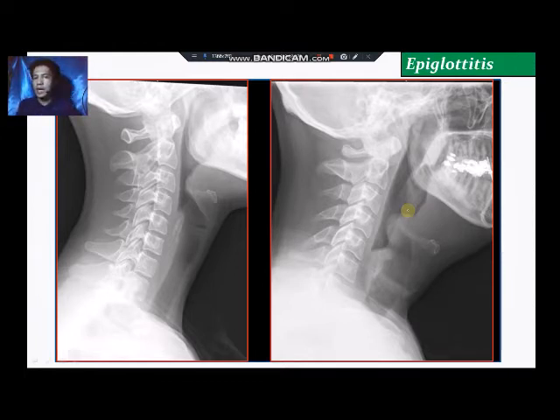Okay, so kung naay croup si patient, possibility of croup si patient, we will take an AP radiograph of the patient. Kung napod siya epiglottitis, best pod siya ma-demonstrate in a lateral radiograph na siya, naka-lateral atong patient, lateral projection atong gikuha. Okay, so this is the epiglottis nga part ni patient. Na siya nga nag-inflame, no? Kana.